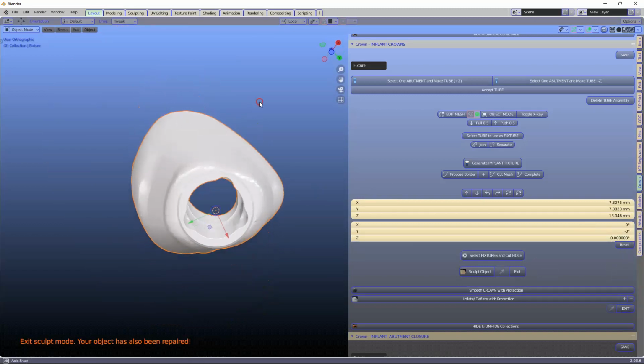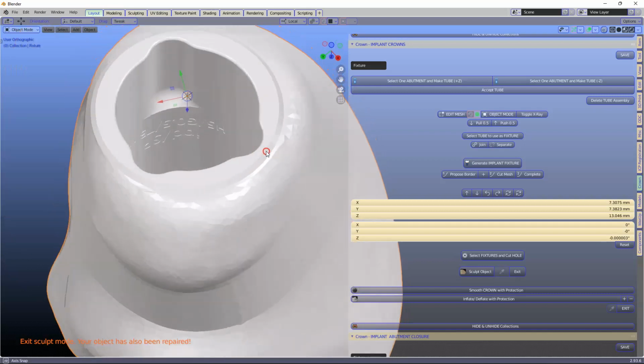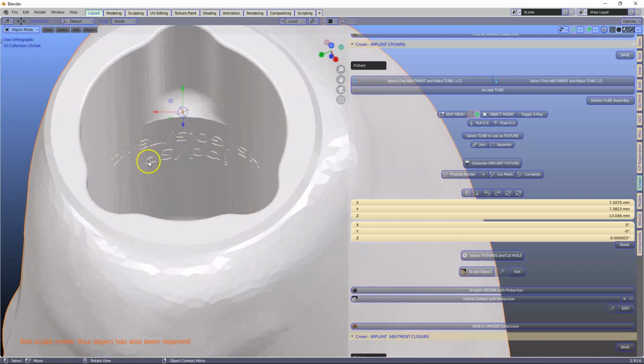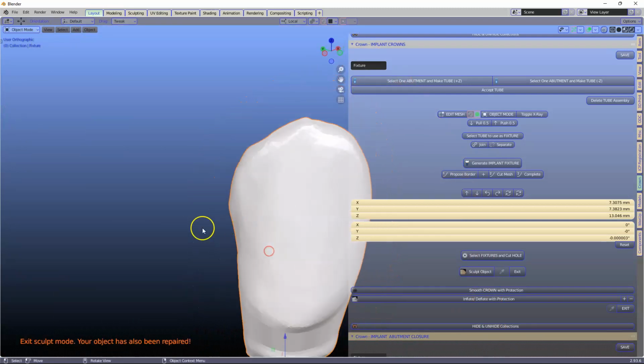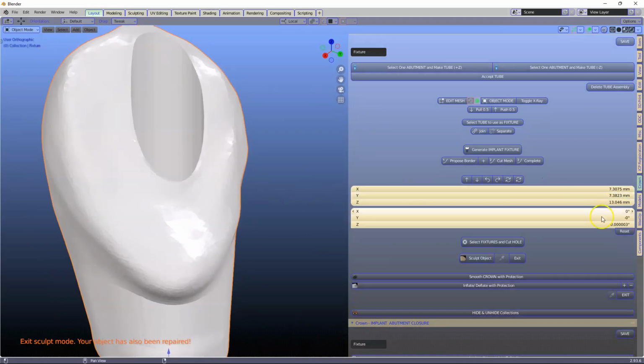Now if you'd like to have these IPD components, you will need the implant and component module. Then simply use the installer for either your PC or your Mac, and that will then reside in your asset folder on your computer.